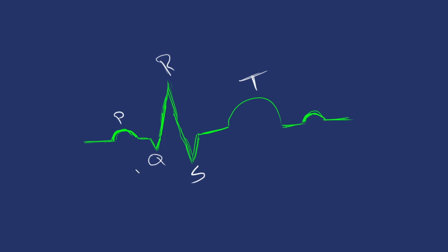When we talk about the QRS portion is where nomenclature can get kind of wonky. Just as we saw with aVF and lead 1, we can have different QRS shapes, right?